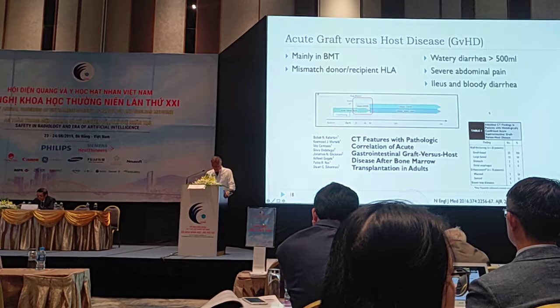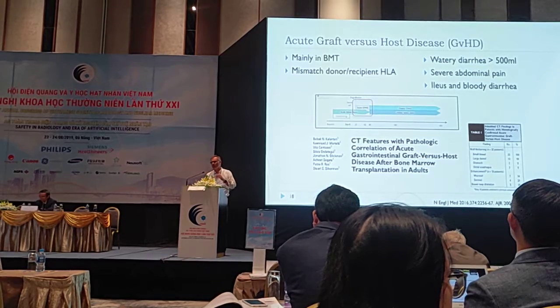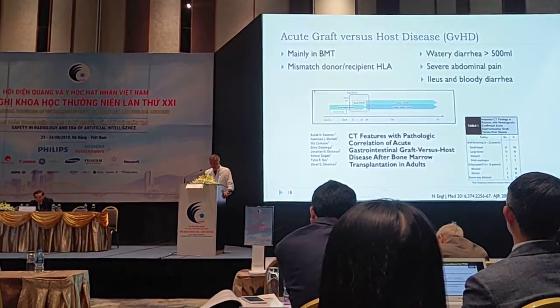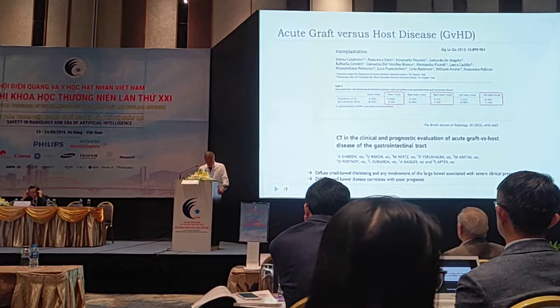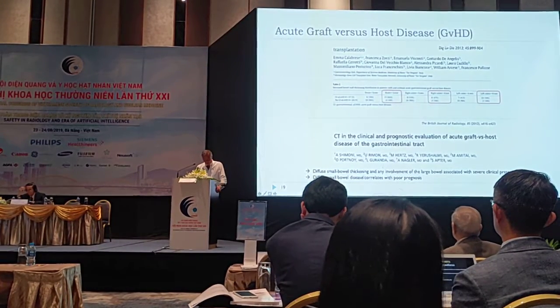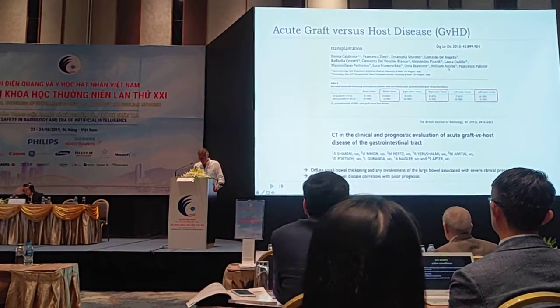And what we can see is that we have mostly manifestations at the level of the small bowel. It's different from the 2 other conditions, where it affects mostly the colon. Graft-versus-host disease in the bowel affects mostly the small bowel. You see here diffuse small bowel thickening, and involvement of the large bowel, and you see here that it's mainly a manifestation that affects the small bowel.